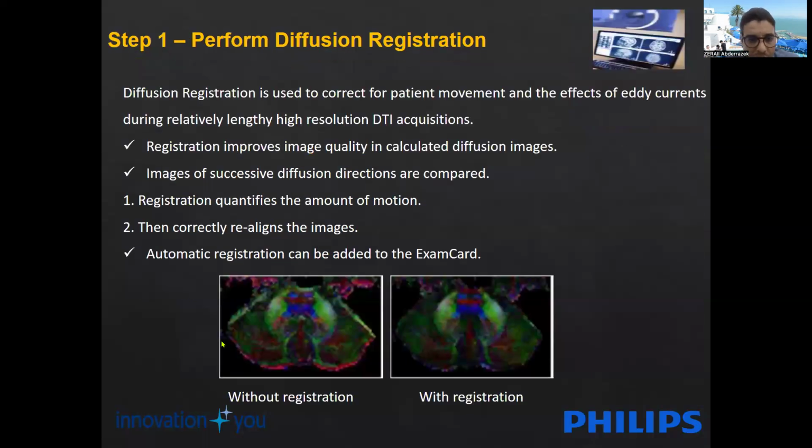The diffusion registration is also meant to remove the different eddy current and motion effects.